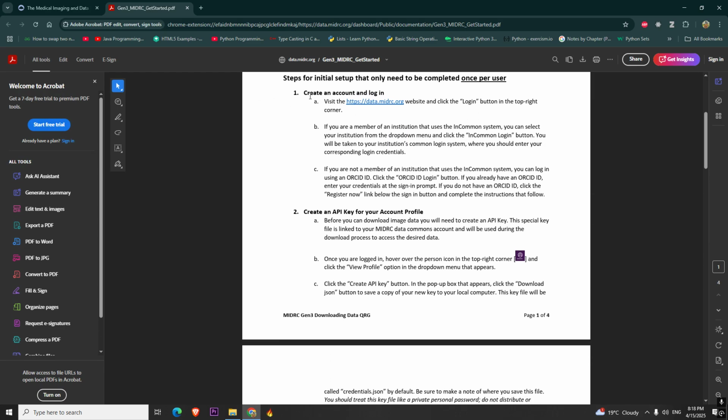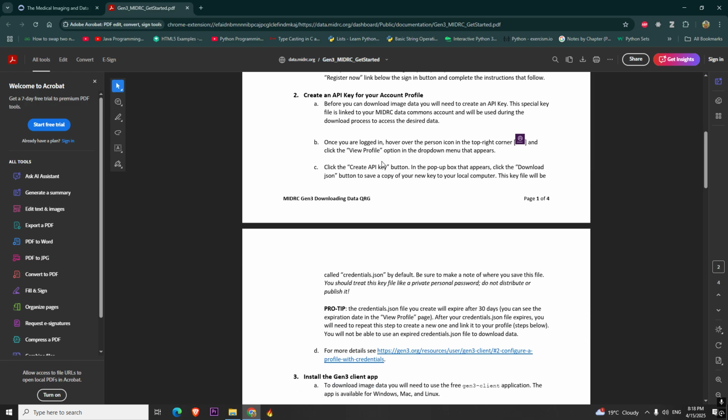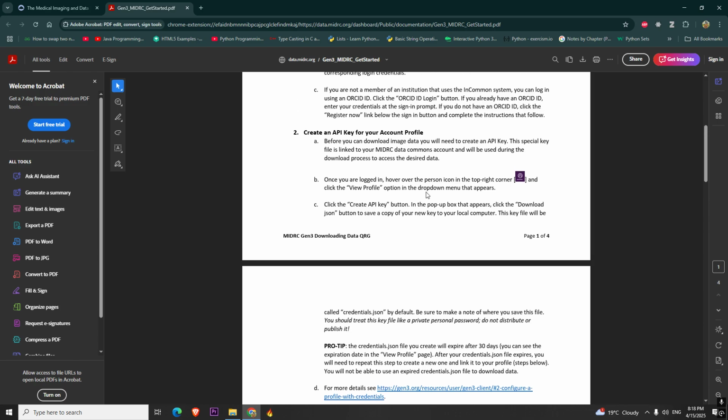As you can see, we just created an account and logged in using our ORCID ID. This was all clearly mentioned in this step, but you may wish to follow this video because in some parts you might get a little confused if this is your first time. Honestly, I was too confused in the beginning, but I managed to finally break all the barriers.